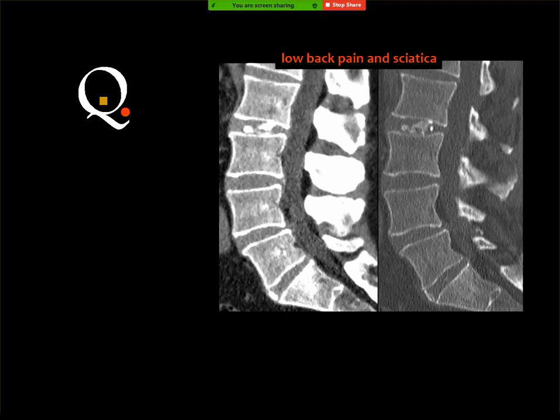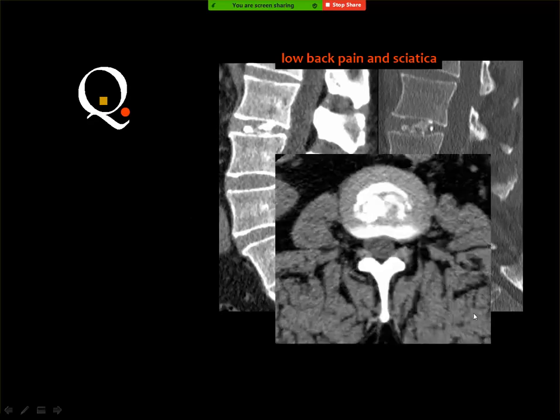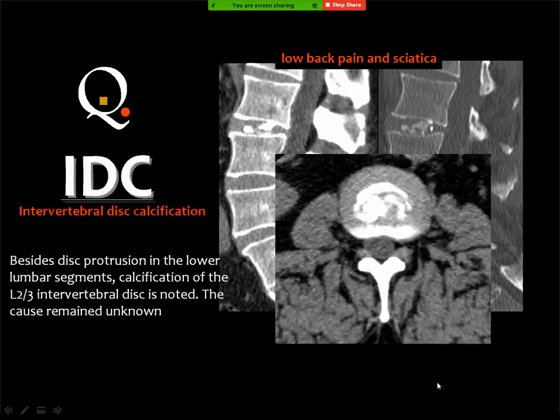Calcification, intra-articular? Yes. Disc replacement? Disc space cage? No. This is just calcification within the disc. There is calcification inside the disc. No surgery, and this is just calcium within the disc itself.